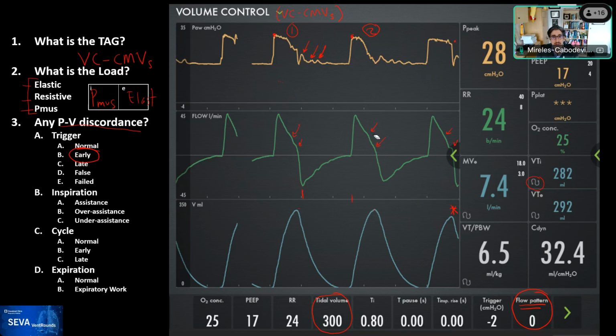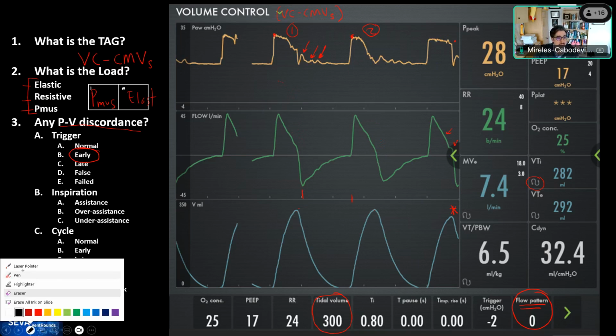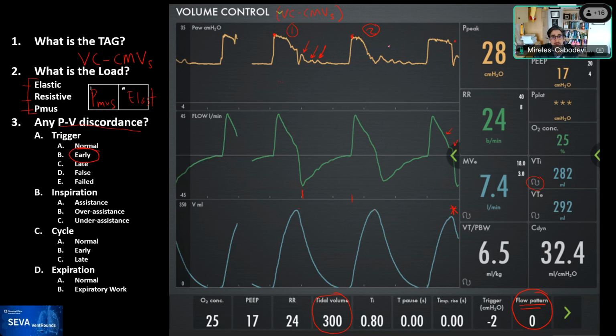Much nicer. Now that we have erased all this nonsense, let's draw the things that I'm seeing for you. So you can see here, here, here, here, and here. There's one last one. So what are your thoughts there? What's causing that?